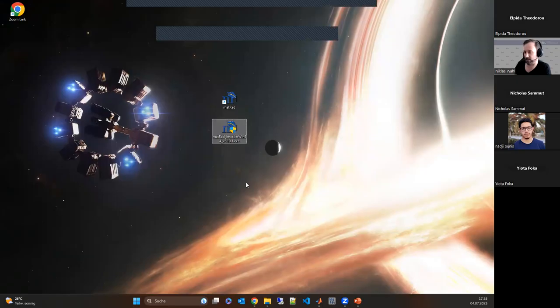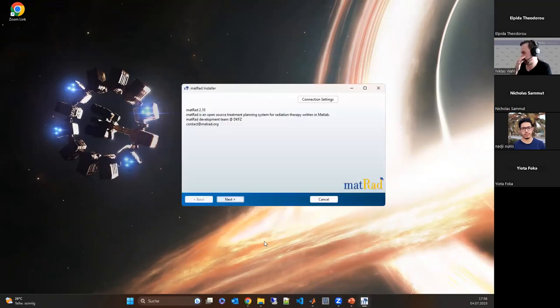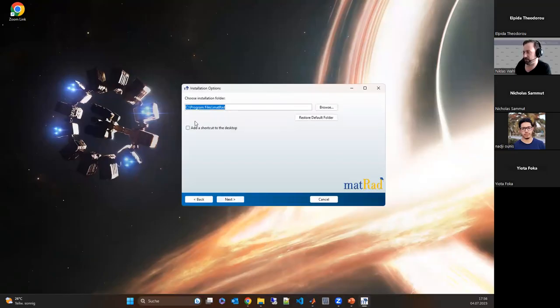I can launch it. It will ask me for stuff. You will see some form of short splash screen, which for me was very quick; probably you didn't see it. Then it takes really a while to load the installer, and it opens on the wrong screen for me. But it looks like this. This is the installer. This should open, and you just click through it, give it an installation path.